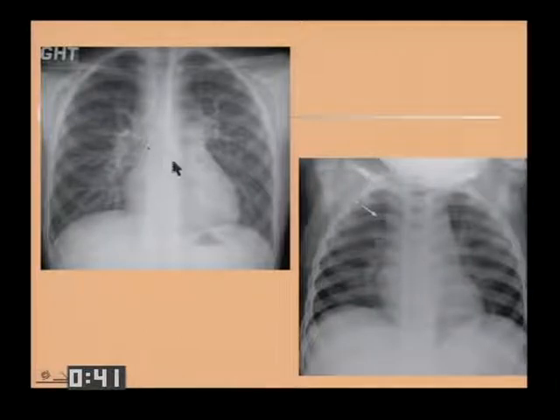And it can give you this contour looking a little bit like lymphadenopathy, but the tip-off is that the vessels are up, and you can have an azygous vein, and in some patients you'll have that extra fissure in the right upper lobe.